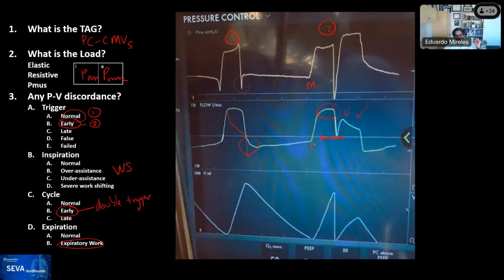This little period of time that I'm putting a box around is only Pvent. Then you see it rise further because it's now Pvent plus PMUS. That's the reason why you see the flow increase. It looks exponential, but it's sinusoidal. Similar to the others, it does effort up and then starts decaying, triggers the other breath, then goes quiet and the patient exhales.